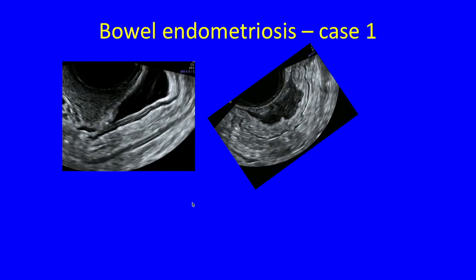If you have endometriosis that's affecting the bowel, the rectosigmoid usually, this is what it looks like. So you can see this was the normal muscularis layer. It's dark with a little white layer in between, and that is where the longitudinal and the circular fibers meet. So you get a little white line, a little interface. So you know that that is muscularis, muscle.